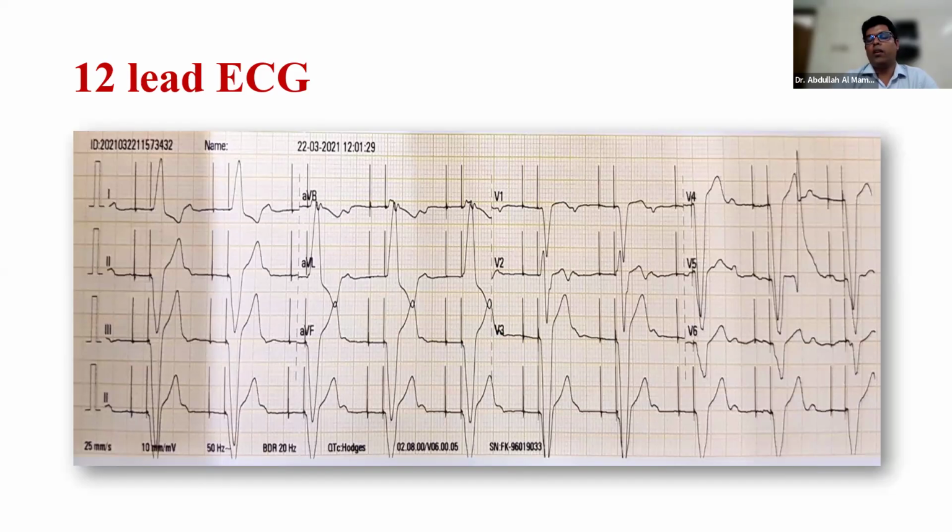So can anybody comment on this? I think it might be a bit difficult one. Can you please proceed? Then I'd like to request Jamil sir to shed light on it. But before that, you explain your thoughts on this ECG.